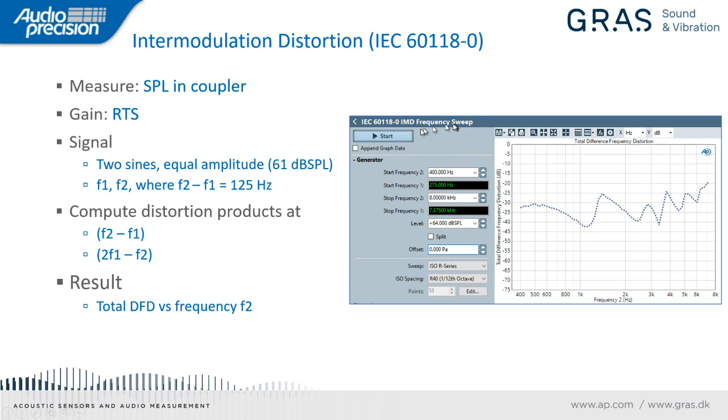And just like the ANSI test, we have a special measurement in the APX software that we've just added called the IEC 60118-0 IMD frequency sweep.